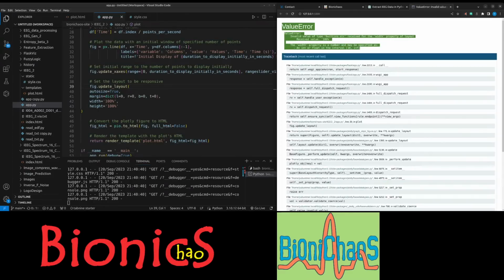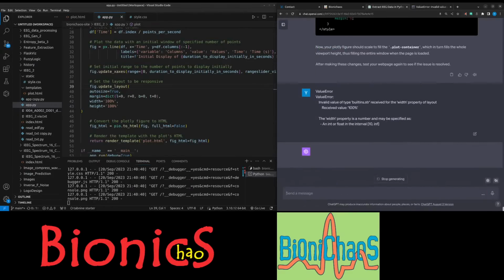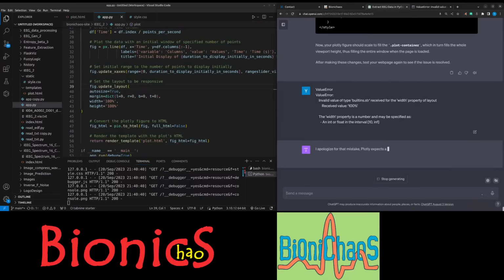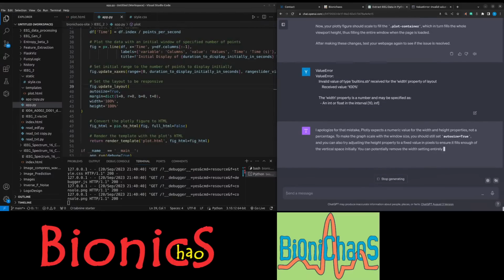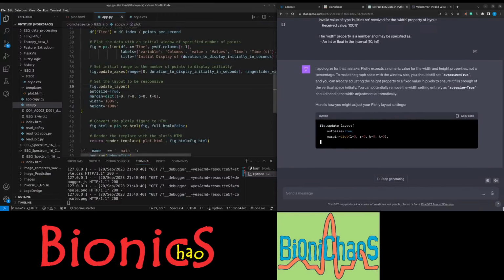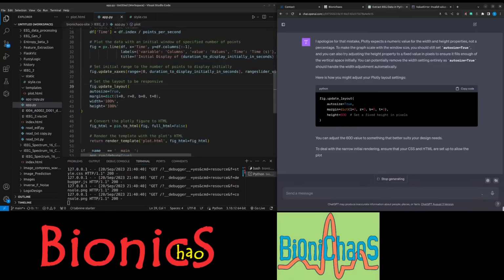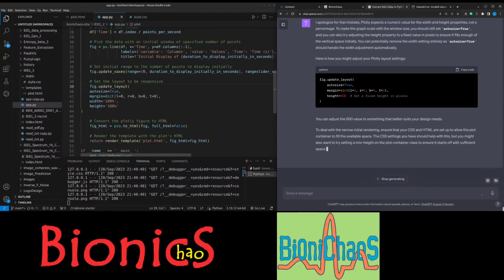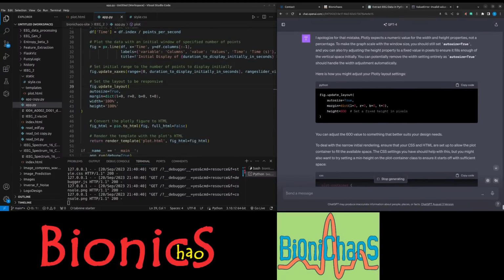Getting this error. If we're not able to solve this in one prompt. Bigger. Update layout.